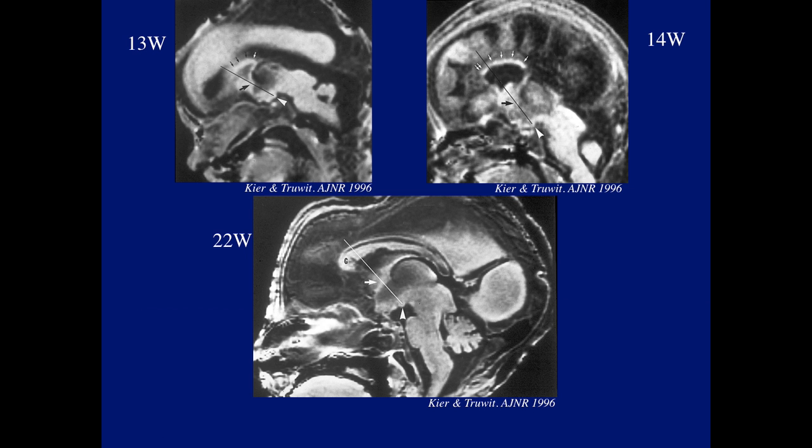And here's the clincher on fetal MR on intact specimens. Here's a 13 weeks. Look, a very small corpus callosum behind the line, and at 14 weeks you see a little bit of rudimentary corpus callosum now developing in front of the line, and here's the beginning of the true genu in front of the Mack line.